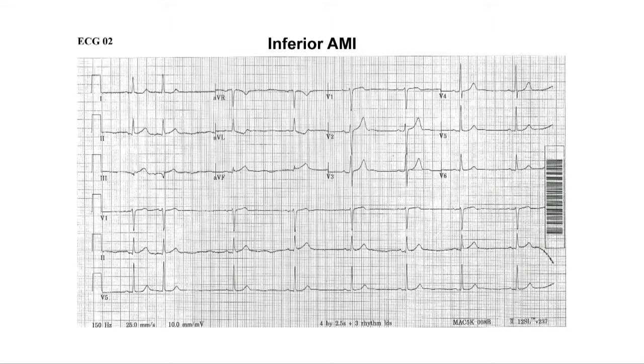Taken in context of the history, so it's very important to join the ECG changes with the history to make sure that it's happening as we speak. Are there any ischemic changes that are acute that are much more subtle than that fairly obvious inferior infarct?